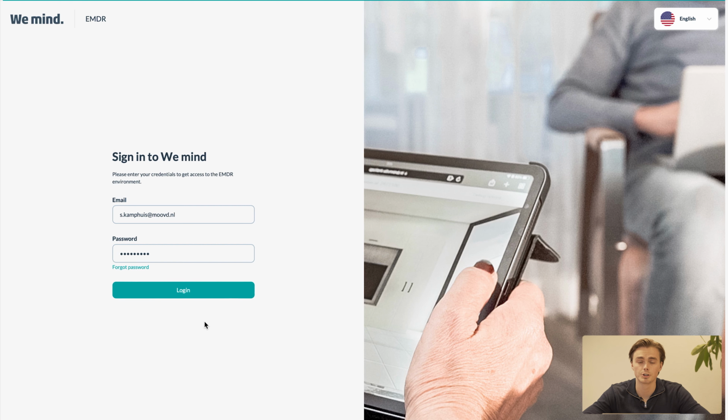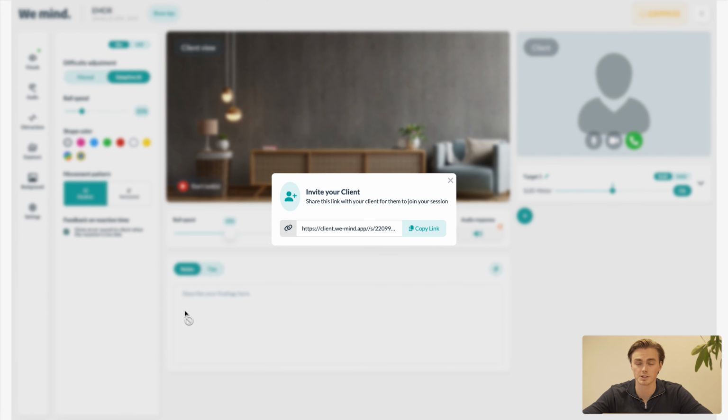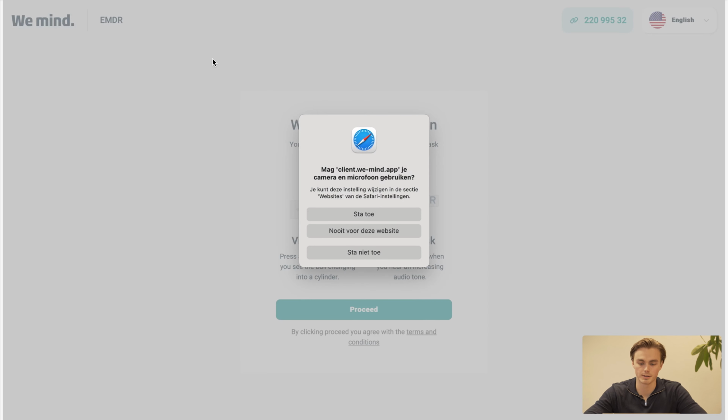Okay, welcome. Today we're gonna explain how all of the different EMDR tasks work. So as a therapist, I log in. I will start my EMDR session and I will do that by connecting and sharing a link. So I will share this link with my client, I copy it and I can send it to my client. Or for this demo, I open a new window and I go to that link.